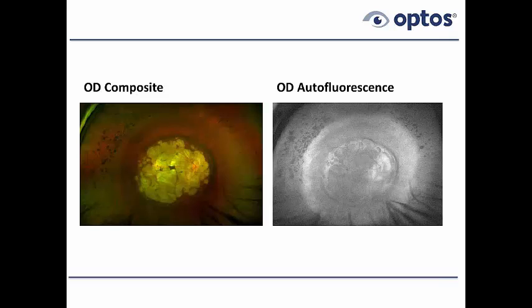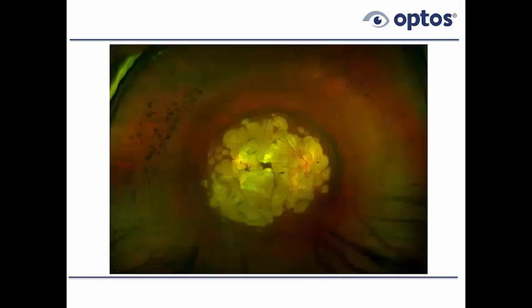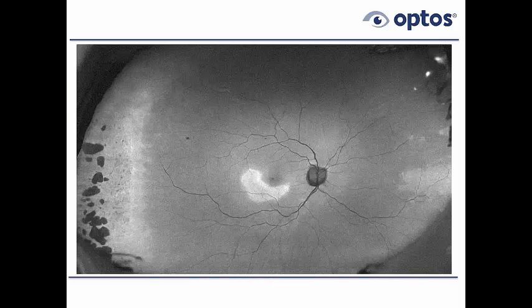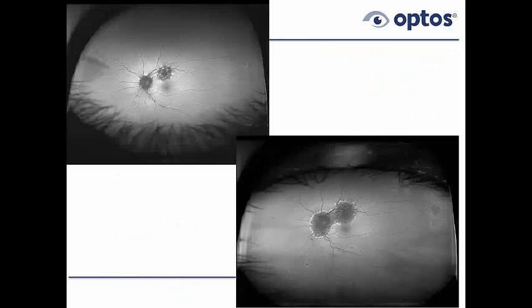Does AZOOR have a predilection for central versus mid-peripheral retina? And are there any typical levels of acuity loss? Often in AZOOR, the acuity is actually fairly good. And here's an AZOOR with good acuity. In this case, the acuity is actually 20/20. Usually, the lesions are close to the disc. Often, they're contiguous to the disc, as this one is.